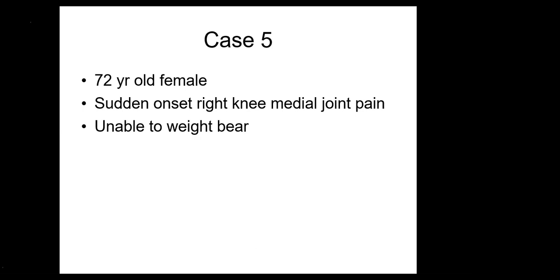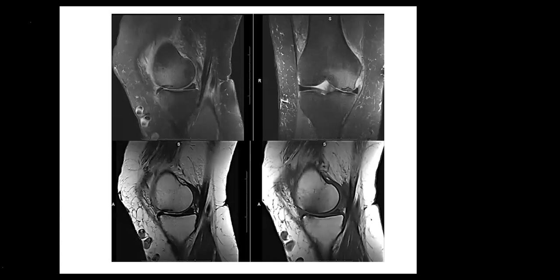But when it is sudden, it is subchondral insufficiency fracture. They break the bone in the subchondral region, and they present acutely with pain. So this is what subchondral insufficiency fracture looks like on X-ray and also on MRI. Okay.